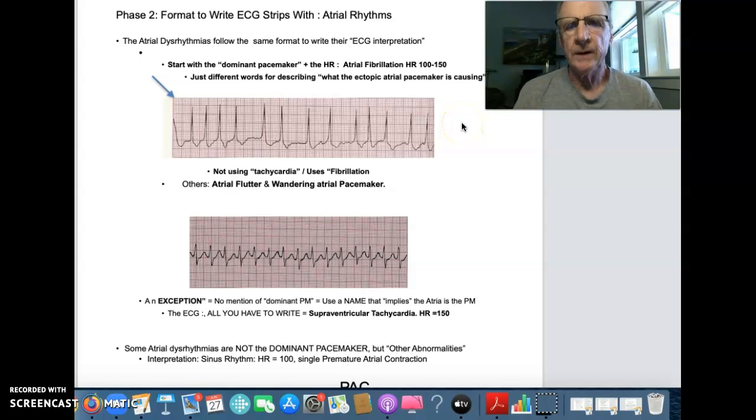This is another short video focusing on how you're going to write your interpretation of an ECG strip that you're looking at, where the dominant pacemaker is in the atria. The dysrhythmias that we see when the dominant pacemaker is in the atria are the atrial dysrhythmias. They're all abnormal, but you go through the same sequence of steps to ascertain what you're looking at.